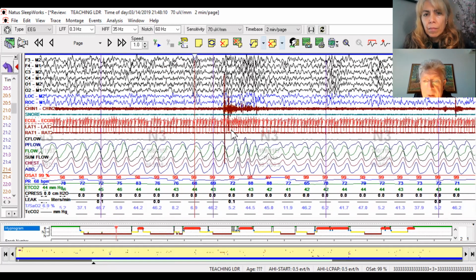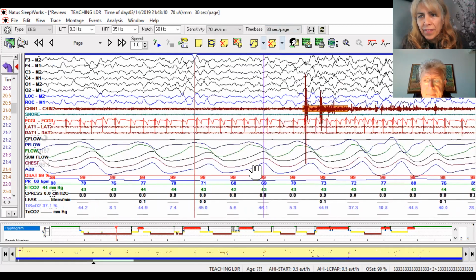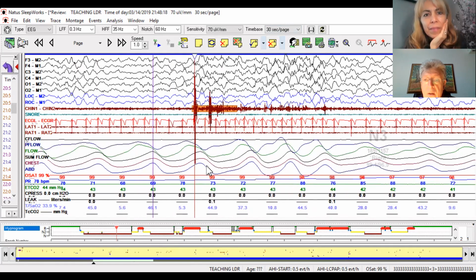Right. You see, here, please put this on 30 seconds. I will show you one thing here. Okay. So you see here, it has been indicated as an arousal, no?